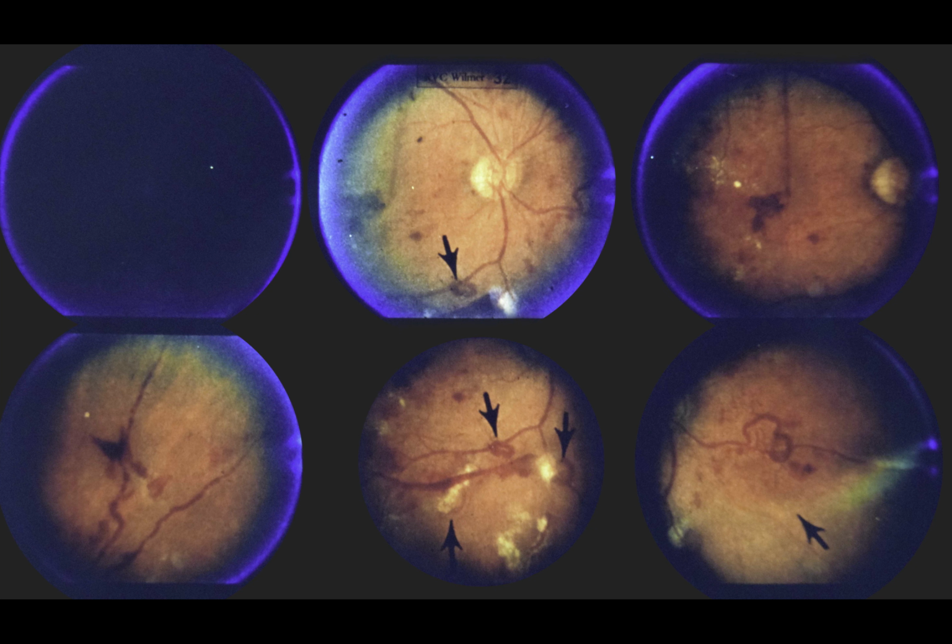Upper left, note dense vitreous hemorrhage in left eye. Upper center, note disc neovascularization, right eye. Arrow indicates duplication or loop formation of inferior temporal vein. Upper right, note hemorrhage and lipid in macula, which reduced visual acuity to 20/50. Lower left, note marked beading or sausage-like appearance of veins, small vitreous hemorrhage, and extensive capillary dropout. Essentially, no vessels are seen other than major arteries and veins.